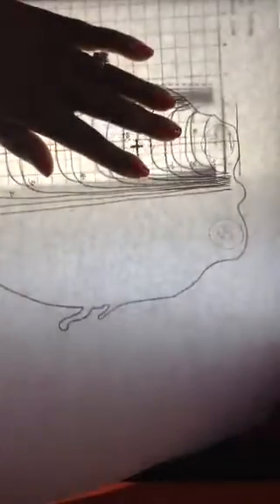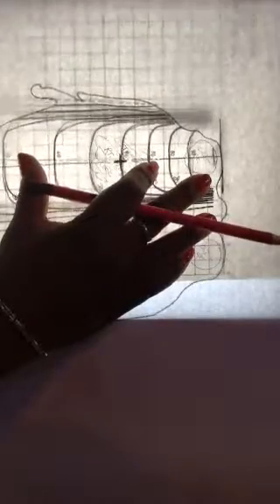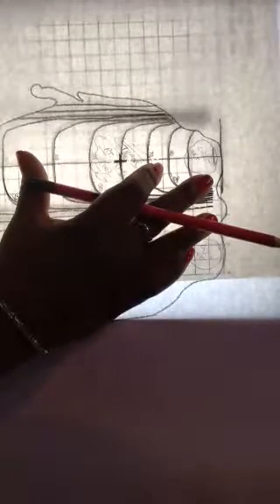Let's get my isodose chart again, line it up again where I traced it, and make sure that I have everything in line. This really makes this easy when you have a light box. I'm going to use the grid lines on the isodose chart to help me decide where to measure my shifts.